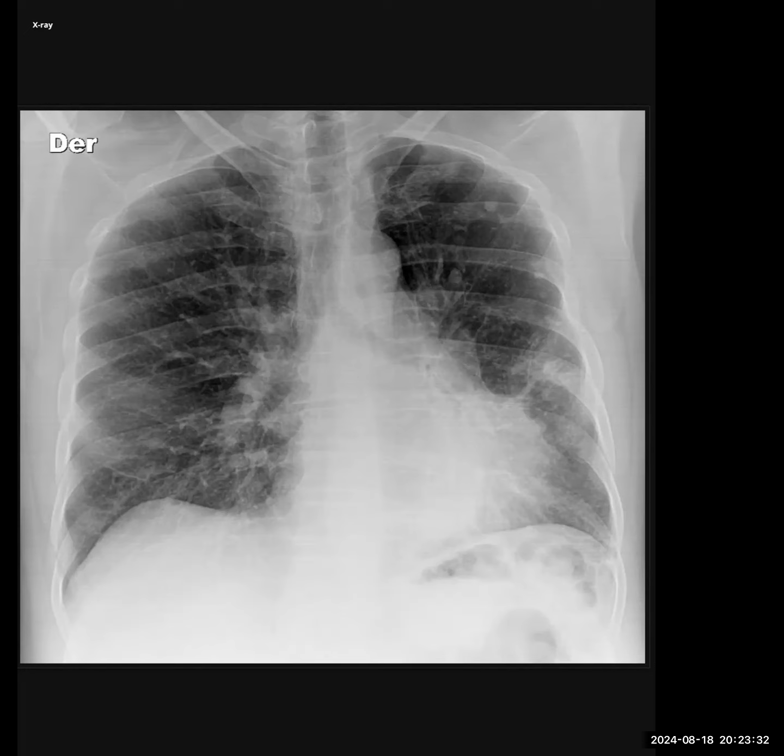I would check previous radiographs of the patient to correlate the findings, and any available history in his previous files. I would convey these findings to the referring clinician and probably order an HRCT of the chest for further evaluation, where I'm suspecting an interstitial lung disease.